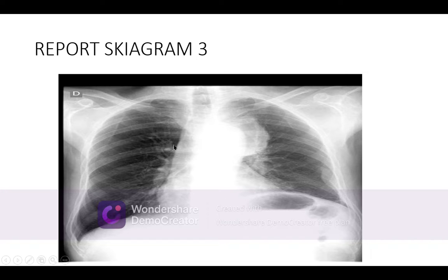The middle mediastinum is divided into two, where the upper right border is changing in direction here. So a line will be made here, a slightly oblique line. The size of the middle mediastinum means heart size. It is normal, I measured it. The shape of the middle mediastinum, the left border here, is very straight, because of the push from above, and it is a globular type of right border. It means that it is normal.